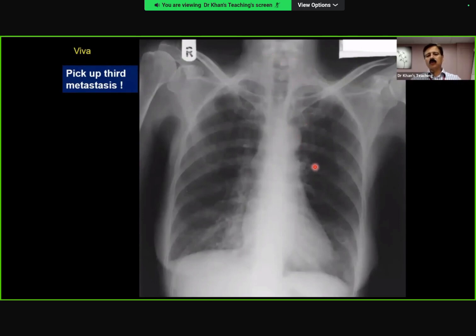So this is the type of observational film for which you have to develop your eyes. And the key thing is to go through your protocol. You will never pick these things up initially. Start describing the X-ray. Never keep quiet. If you keep quiet, then your adrenaline will be released and you will be so much under tension that all of your thought process goes down the drain.